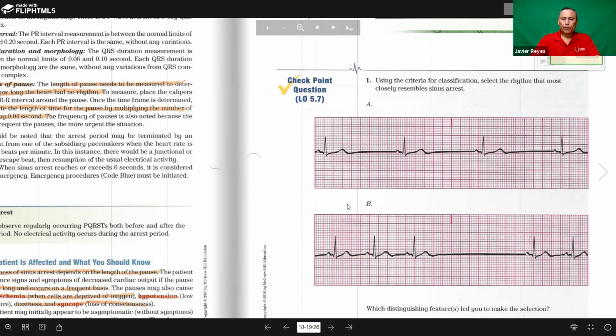Remember, you count the R waves and then you multiply it by 10. Correct. What is the number again? How many? 50. You could say 40 or 50, right? This is incomplete. So remember, this incomplete, you don't count it, right? So for this, you could say 40 or 50, it's still below normal. It may not be enough blood flow for your body to live on. You're not gonna feel rested.